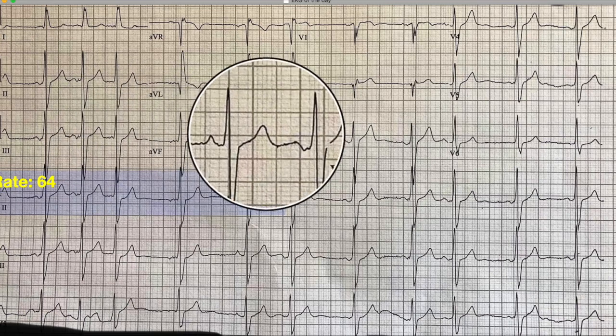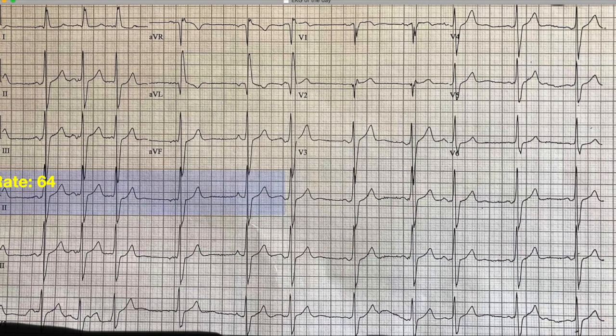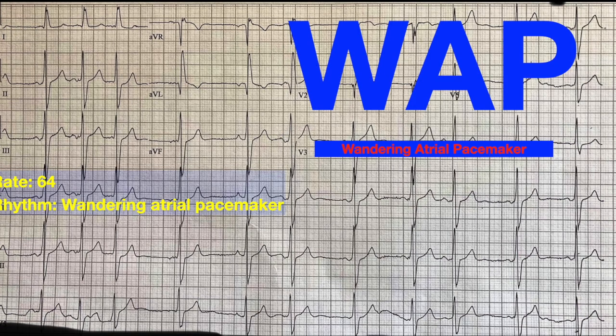From beat to beat, that P wave looks different than that P wave, and they look markedly different from each other. So I'm going to go ahead and call this a supraventricular rhythm, meaning it's not coming from the ventricles itself. But I'm going to make the call here that this is a wandering atrial pacemaker, or the WAP. What's a wandering atrial pacemaker?